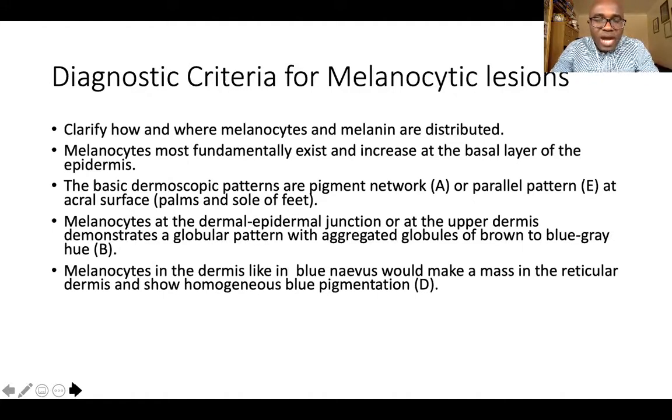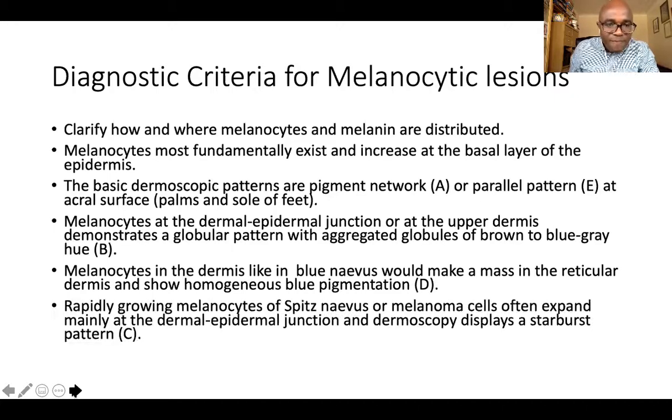Now, I did mention again the blue nevus. This is aggregated melanin in the deep dermis, which shows this homogeneous pigment, and that is the pathognomonic feature of a blue nevus. That is also a melanocytic criterion.